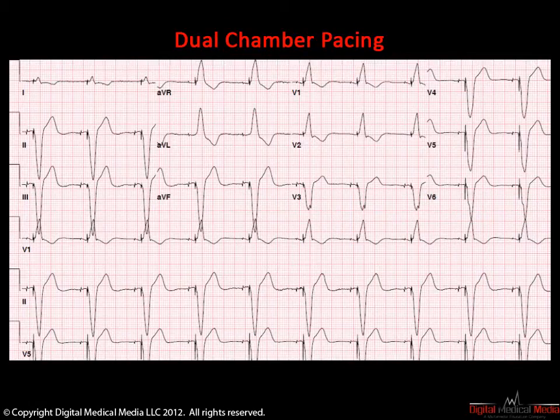The atrial pacing spike is followed by a reproducible and organized P wave. This is best seen in leads 2 and 3. In some of the other leads, the actual P wave is not cleanly visible. Remember, the P wave will not have the expected normal sinus rhythm appearance. The appearance of the P wave in atrial pacing depends entirely on the location of the atrial pacing lead.